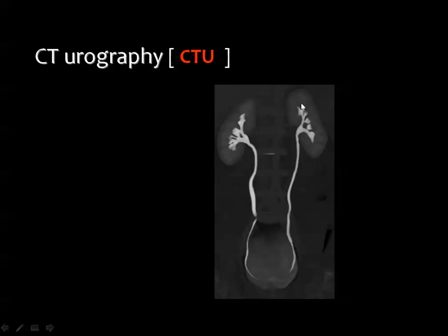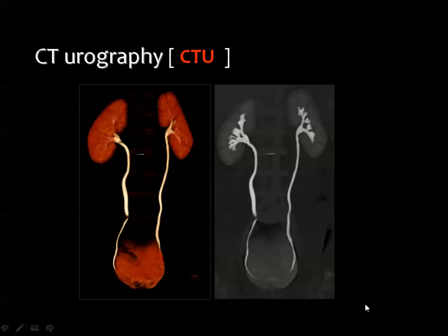And you can see the left kidney, the right kidney, the pelvicalyceal system, the course of the ureter, and the urinary bladder. And many of the machines can produce these color images, which are of no significance in diagnosis, but they usually give better imaging of the urinary system. But here, these images are valuable in the diagnosis.